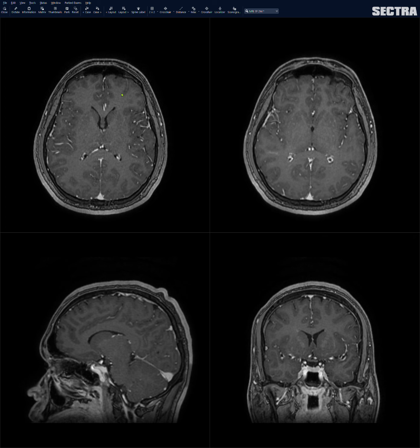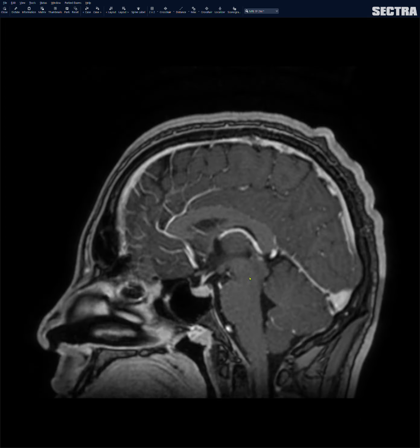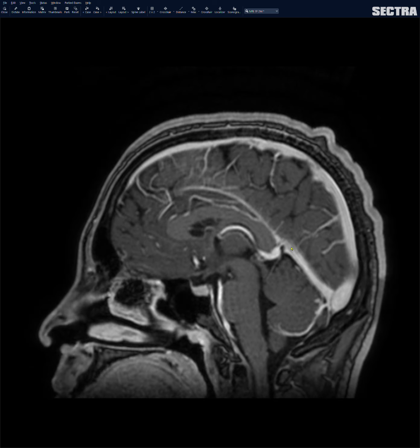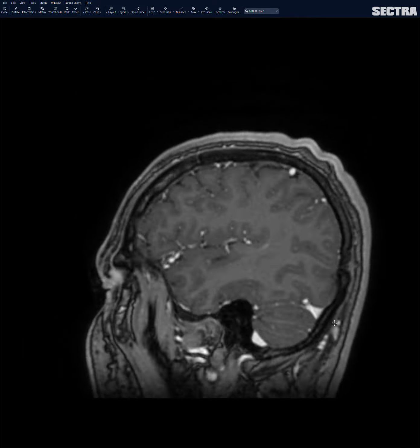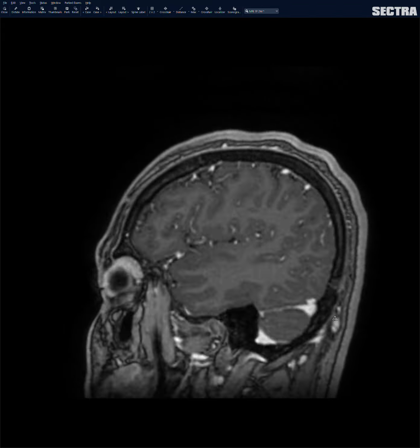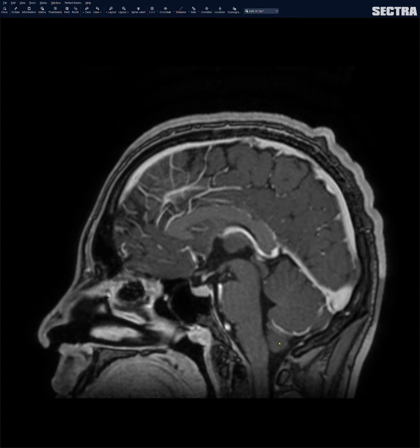Okay, these 3D images are also, as you can see here, reconstructed as sagittal images. Take a quick look at the superior sagittal sinus, straight sinus, internal cerebral veins, transverse and sigmoid sinuses. Make sure I don't miss venous sinus thrombosis. Great. Again, I take a look at the midline structures, make sure there's no Chiari malformation. Look at the configuration of the cerebellum and the cerebellar vermis and the brainstem here.